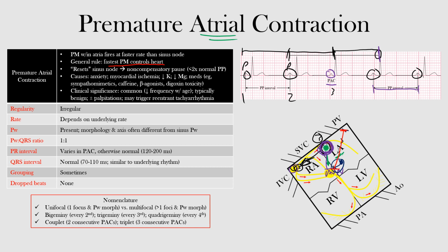So again, the PR interval is based on where the origin of that impulse is coming from, the ectopic focus. Now the QRS complex remains normal and narrow, similar to the sinus beats, except for the overall timing of the complex. Once it gets through the AV node, everything below in the ventricles is occurring normally, so we should have normal intraventricular conduction and normal QRS complexes.